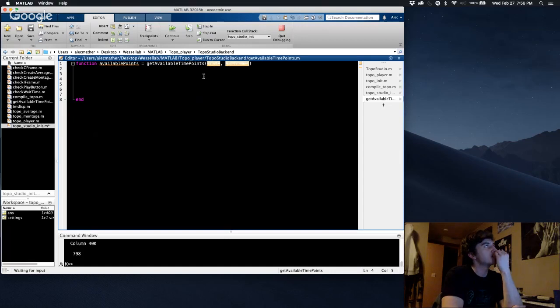So first, we need to get the amount of time between each sample. So we'll call that our sample latency, which is going to be 1,000 milliseconds divided by your sample rate.